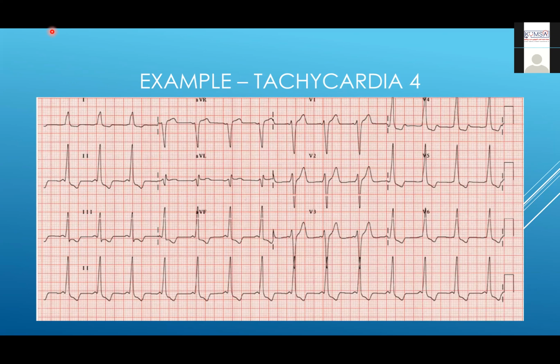What about this one? Does anyone want to try interpreting this?